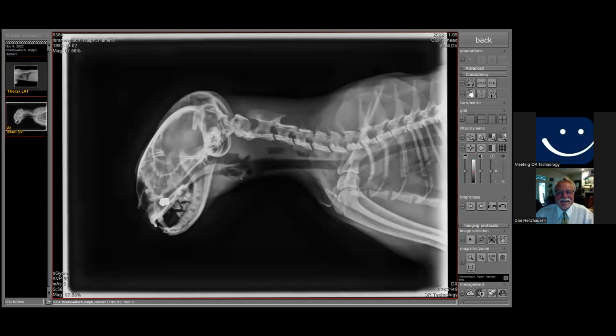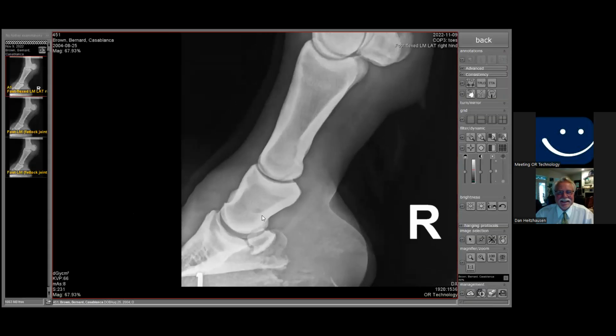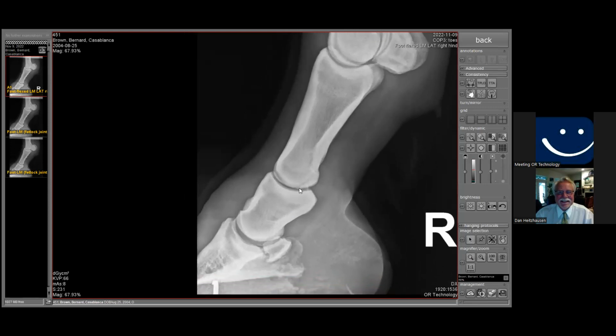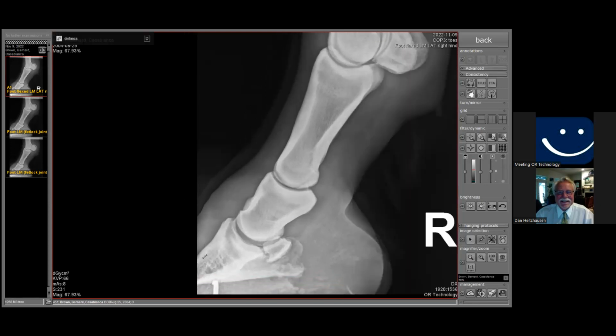And this is where I can do some advanced diagnostics. So as an example, I could do some measurements. Maybe let's switch the horse for a realistic one. I think it is at least. I think I've seen people measure it like this before. So you're something like this. I actually forgot. Oh, not the.